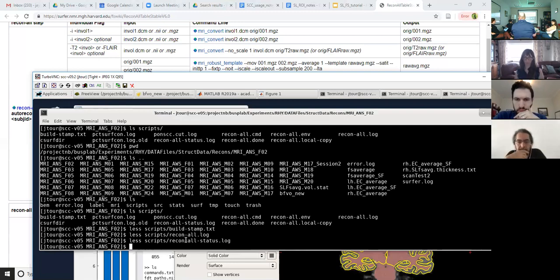So if something went wrong, you can go in and see what it was and recreate your steps. The only thing is if you were to overwrite manual edits. So when we do the review process, we have all these steps that seem somewhat asinine at first, but they're all meant so that you can't overwrite the manually edited volumes.